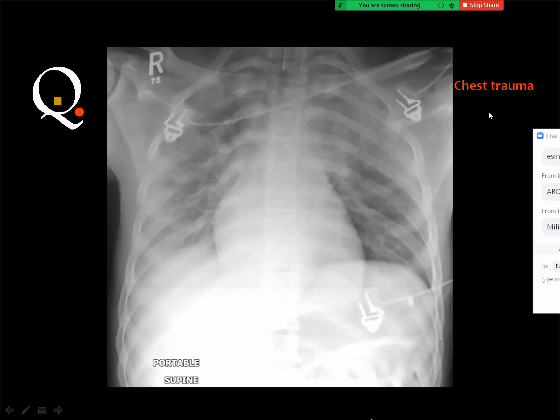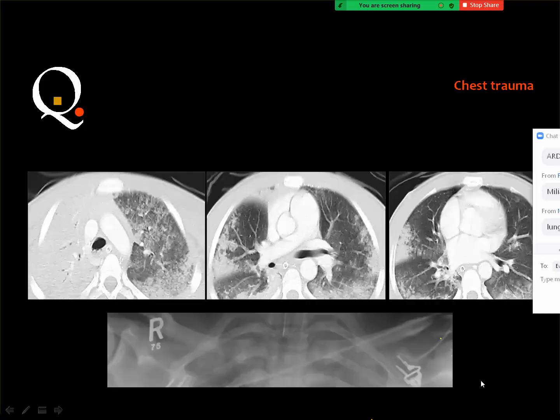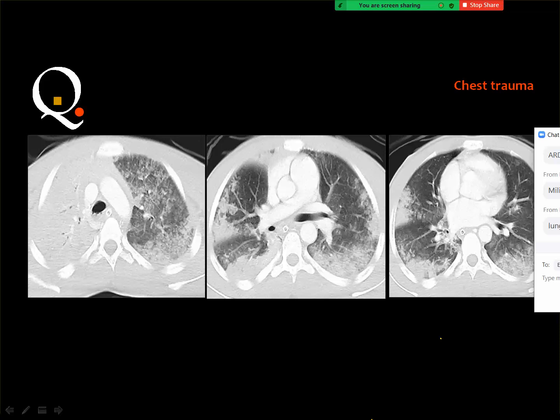This patient had a history of chest trauma. Yes, lung contusion is very good, and this is the right diagnosis, of course. Even if you do not see any rib fractures, you should diagnose these contusions. But if you are confronted by a CT scan like this, and you have no history, or you do not know that the patient is subjected to trauma, you cannot say that these are contusions.